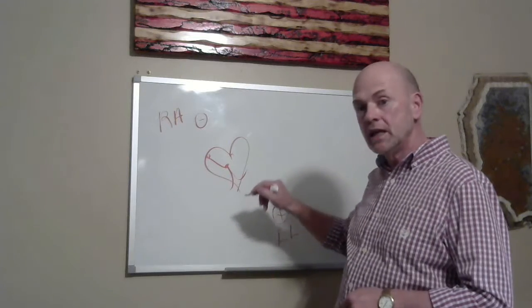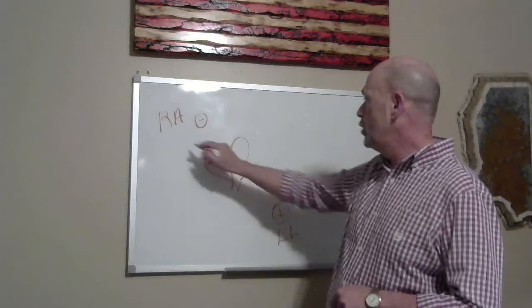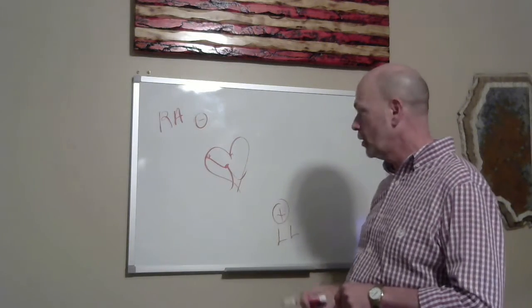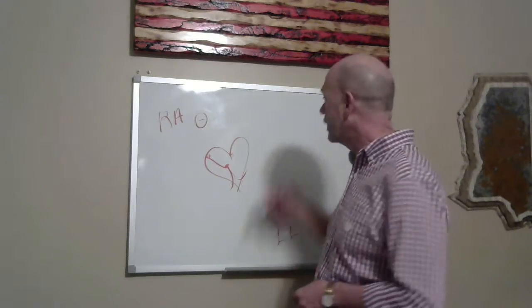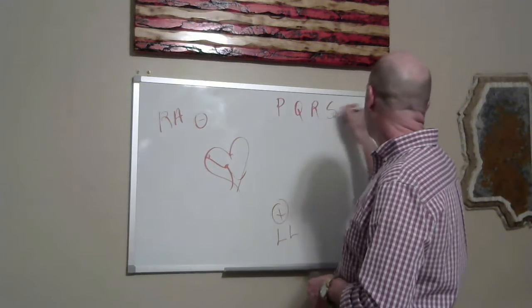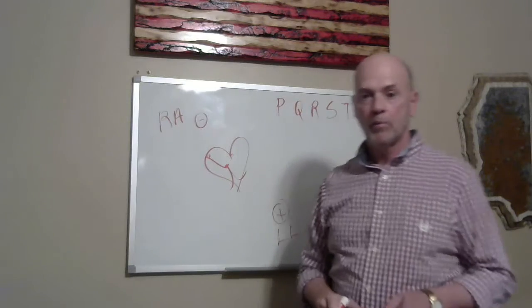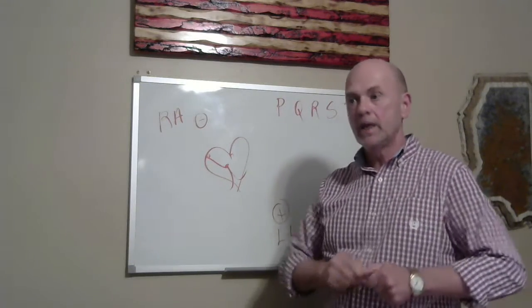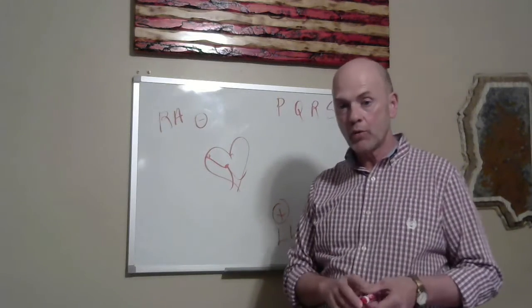We can see a positive waveform as the electrical energy moves from the SA, AV, down the bundle of His and left and right bundle branches that are associated with each of those functions of the heart. We use the P, the Q, the R, the S, the T, and sometimes U variables to identify what each of these deflections on the EKG monitor represent.